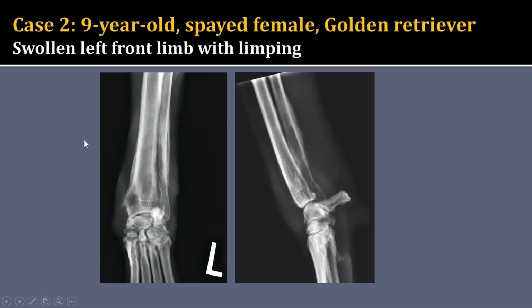Relatively benign to semi-aggressive periosteal reaction. Also, relatively non-aggressive geographic lysis, although some of it might be a little bit moth-eaten. So the fact that we have this irregular soft tissue swelling, as well as at least 2, if not more, bones involved, my differentials have to include something like a soft tissue tumor, so like a soft tissue sarcoma.